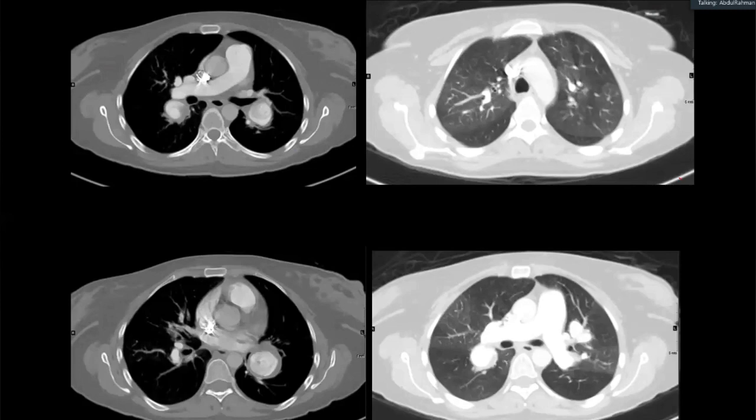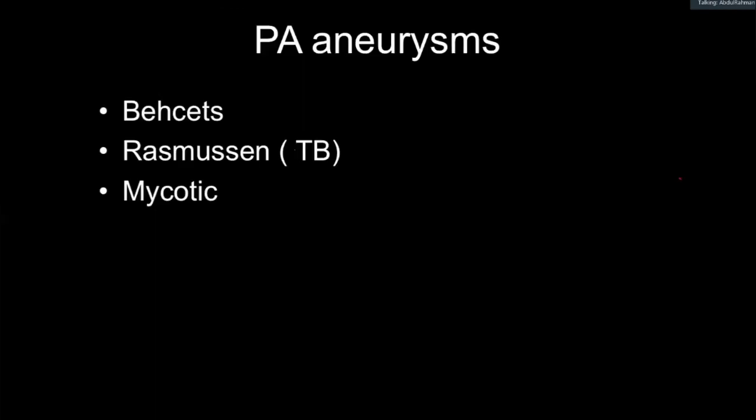Pulmonary artery aneurysms, if I would like to take the age of the patient, and if he's a young patient, we do see that in syndromic diseases, or we see that in connective tissue disorders such as Marfan and Ehlers-Danlos syndromes, or we have that association with Behçet disease, Behçet syndrome, pulmonary artery aneurysm. I would like to take the history of any ulcerations in the skin to confirm that. So you can see here some ground glass change in the lungs and bilateral pulmonary artery aneurysms, and this indeed was Behçet syndrome.